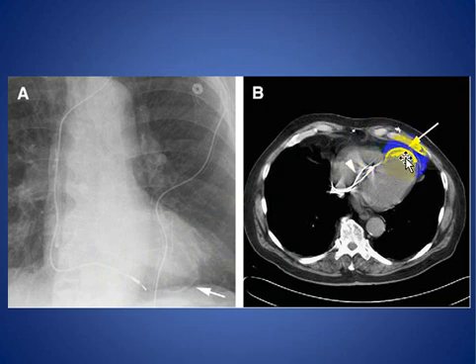Here another patient with myocardial calcification, curvilinear calcification due to myocardial calcification at the left ventricular apex. Also, the patient has a pacemaker.